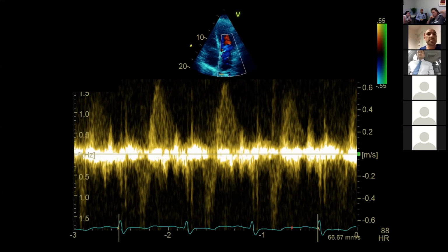Can you run the video again? Oh, there's no video. It's just a still. It's probably across the mitral valve, because I don't think it's across the pulmonary. So if it was the mitral valve, as in across the inflow, which part of the cardiac cycle would you expect blood flow to be above the line? It's diastolic above the line. Nice. So this is probably the mitral valve. And what shape would you expect it to be in there? Sorry, I just withdrew it.